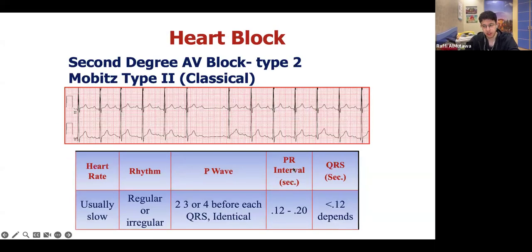Now, there's a question that I think someone might come up with watching this video later. Let's say I don't recognize this delayed PR, like this one over here. Let's say this to me looks like normal sinus. This is actually smaller than a big box, so maybe it might be a normal PR, and this might look like a normal QRS. What differentiates this from a premature contraction, besides the words tachycardia and bradycardia? Like we said, besides this beat drop, it's otherwise normal. We don't call this a premature atrial beat or anything like that.